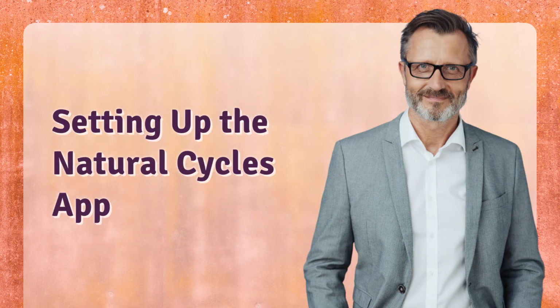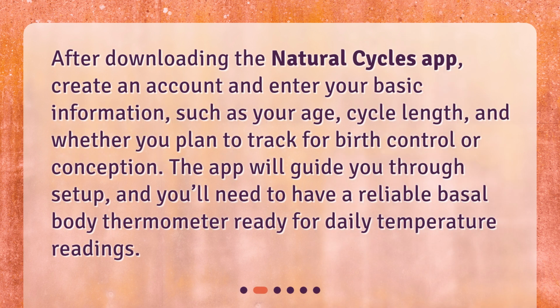Setting up the Natural Cycles app. After downloading the Natural Cycles app, create an account and enter your basic information such as your age, cycle length, and whether you plan to track for birth control or conception. The app will guide you through setup, and you'll need to have a reliable basal body thermometer ready for daily temperature readings.